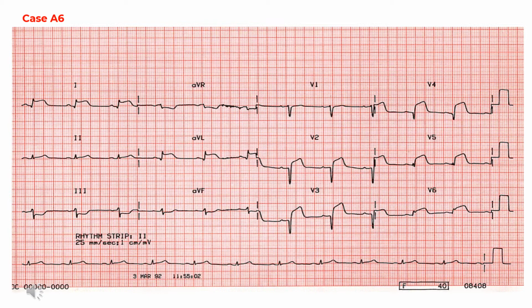There are pathological Q waves in leads 1, AVL and precordial leads V2, V3 and V4. There is extensive loss of R wave in the precordial leads. No R wave is seen at all until V5, and this is only a very small positive deflection, as is the R wave in V6.